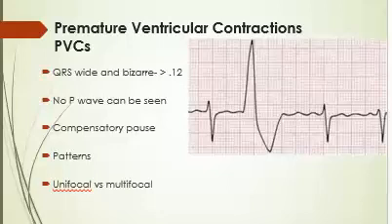Okay, and for the record, the PVC is not giving you the cardiac output, okay? So it's not what we want to call a real beat. It's actually a warning that we need to check and assess our patient and assess some things about our patient. And like I said, when we talk about treatment and management of this patient, we'll talk a little bit more about that.